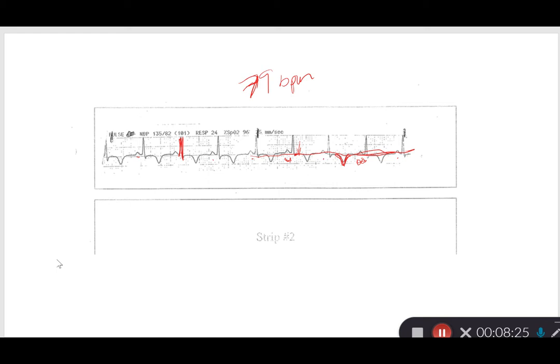We do, however, want to include that these T waves are definitely inverted, upside down, whereas in a normal rhythm, we would see them be upright. So my rate is normal, between 60 to 100, so it's not bradycardic, it's not tachycardic. It is sinus because my P waves are all normal. I have a normal PR interval. We have a narrow QRS complex, so it is sinus.